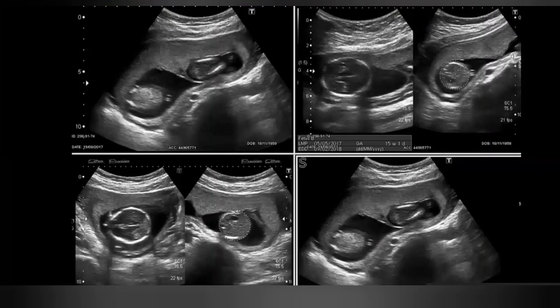You have cases of twin pregnancy. You have to differentiate whether this is diamniotic, dichorionic, and you have to mention it in the early pregnancy. So I will just tell you this is the lambda sign of diamniotic and dichorionic pregnancy. The two placentas have fused and they are extending into this amnion, resulting in the lambda sign. So this is di-di pregnancy, that is diamniotic and dichorionic.